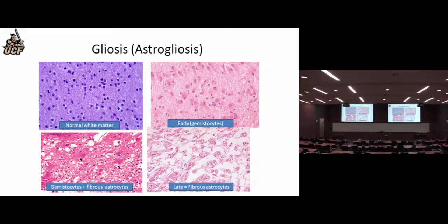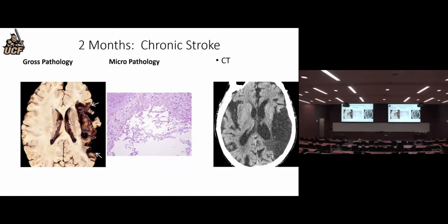Though you could ask, how does that differ from the fibers you see in the myelin? We certainly don't see as many oligodendrocytes, though. And then here, definitely something is wrong. You've got all these white areas where you've lost a lot of tissue and just these fibrous astrocytes later. Also, if this blue is a myelin stain, then we're not seeing it anymore, but I don't know whether he stained it for myelin or not. I showed this chronic stroke one before, just showed this heavily damaged area, loss of neurons.